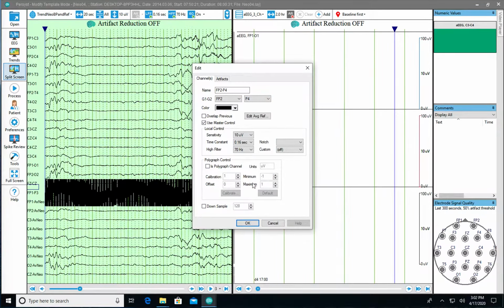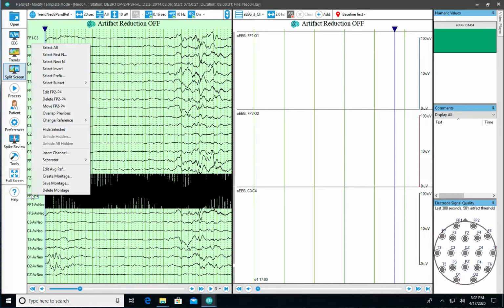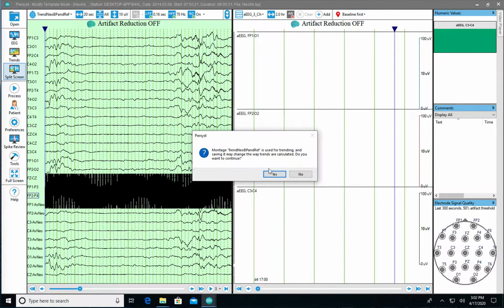And we're going to try out our trends on a recording that has EEG and all those inputs. So we'll hit OK. So now we have these two channels in our trending montage. And I can drag these to whatever I want to have. So I want to save this. Save montage, leave the name the same. Warning, hey, this is used for trending. Do you want to continue? Yep.